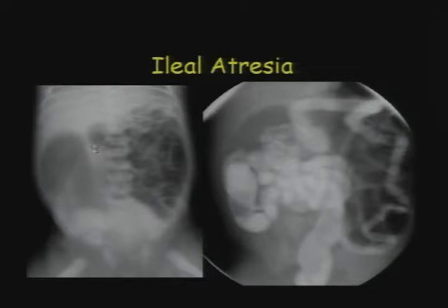And this is a good case to point out that you might want to say that that's the right colon. It's not. You can see here's the right colon. That dilated bowel is small bowel. You can't tell small from large bowel in a newborn.